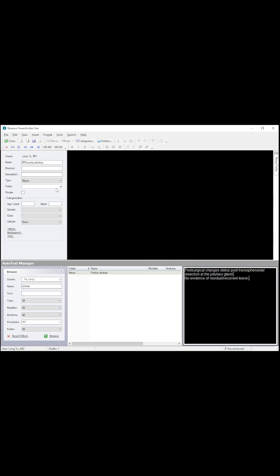I think you might be able to do some of the same things with macro, but I just keep all mine as macro, in part because our institution doesn't allow me, as an end user, to associate templates to exam types and have them auto-populate. So I just have to put in every template on my own, after the default comes up.